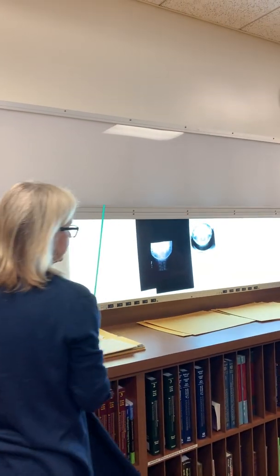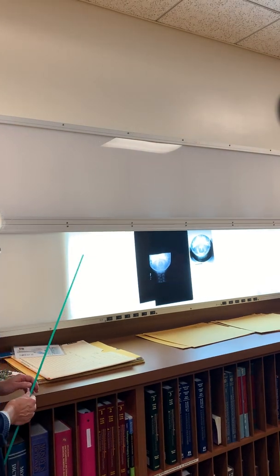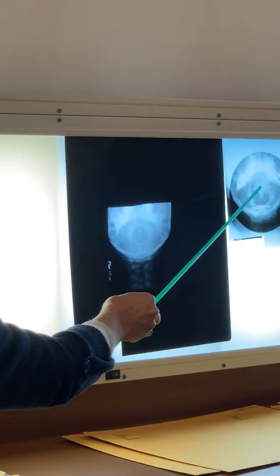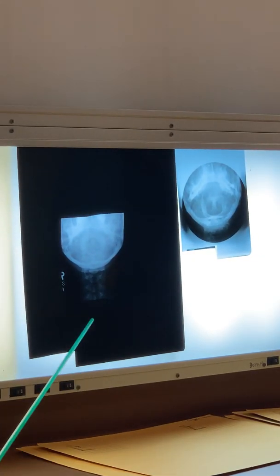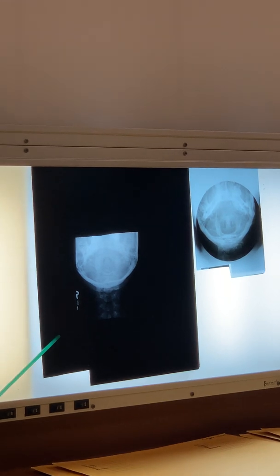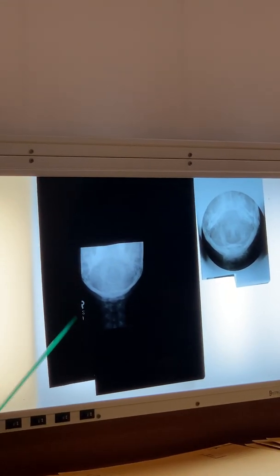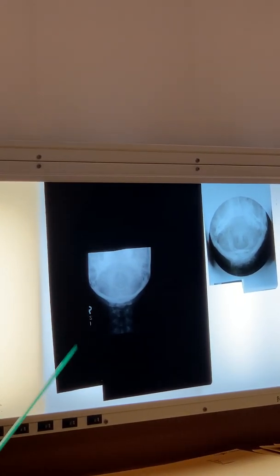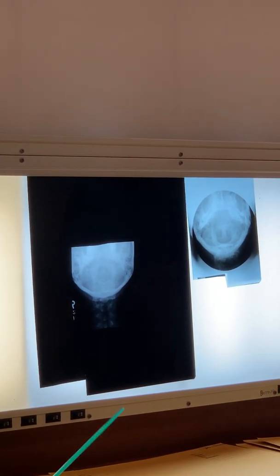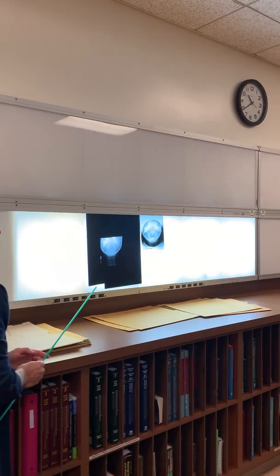So here's two Fuchs. As you can see, you don't see apophyseal joints on the Fuchs. It's only for the odontoid tip or process. This one, I don't know. It looks like they manually did collimation after they shot it. That's horrible, doing a straight line. It's like an unportable line.